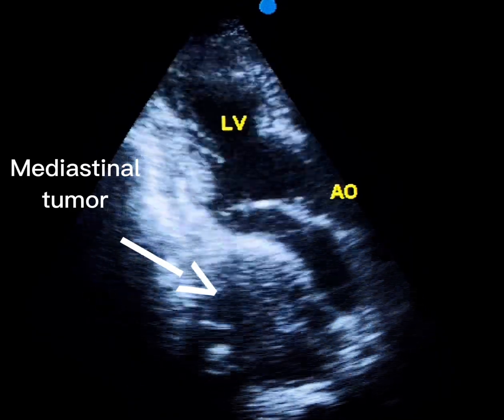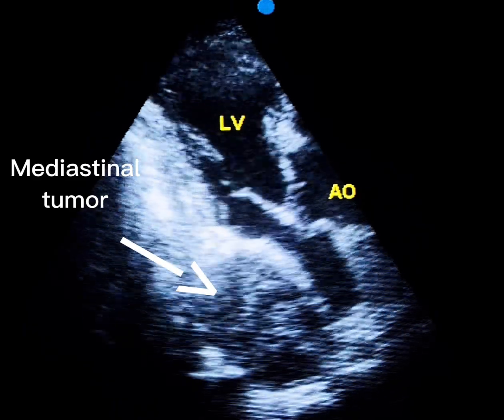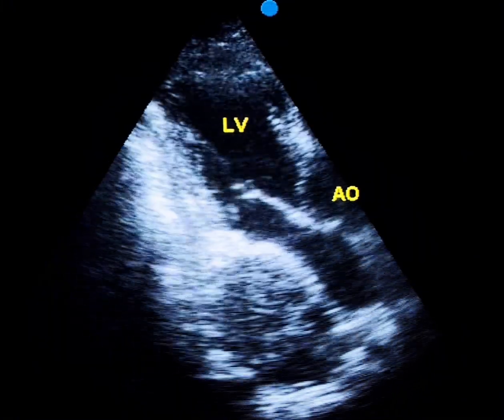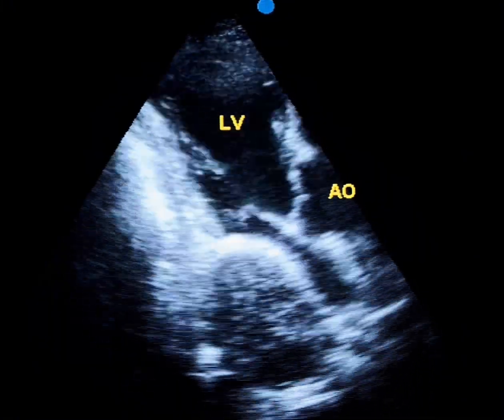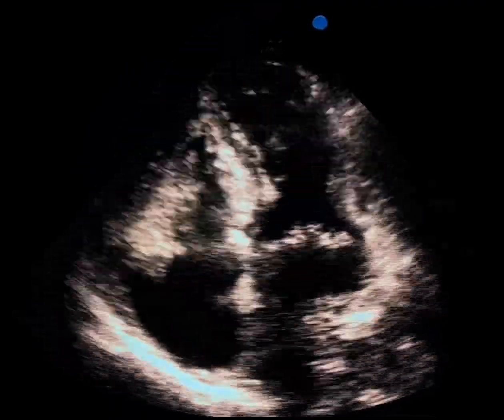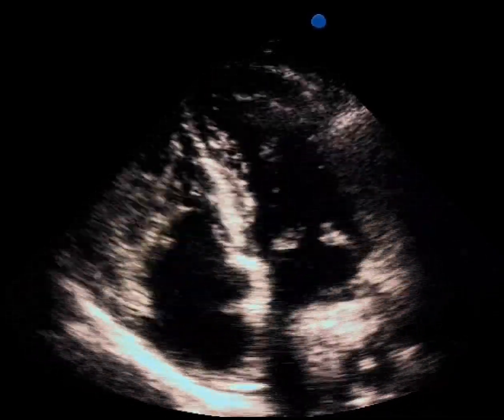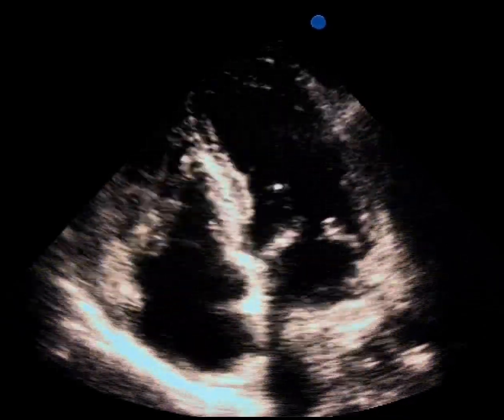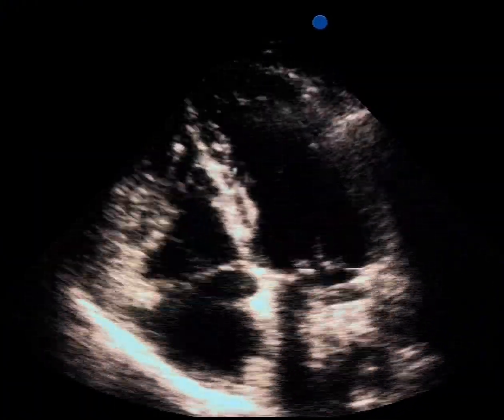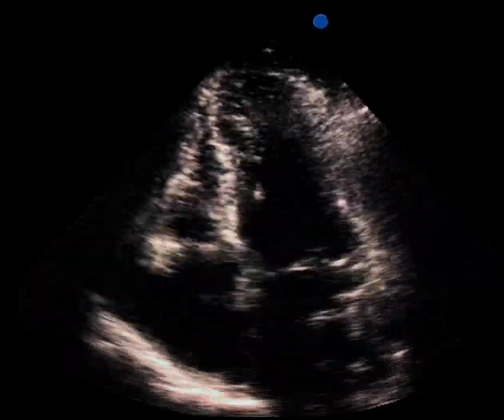The ultrasound beam is narrowest at the focal zone and becomes thicker both nearer and farther from it. So the artifacts are generally more when the region of interest is away from the focal zone. In conclusion, whenever an apparent intracardiac mass disappears with a slight probe angulation or cannot be reproduced in orthogonal planes, always consider slice thickness artifact before diagnosing thrombus or tumor.